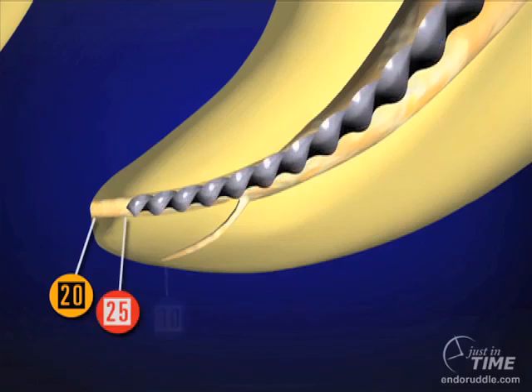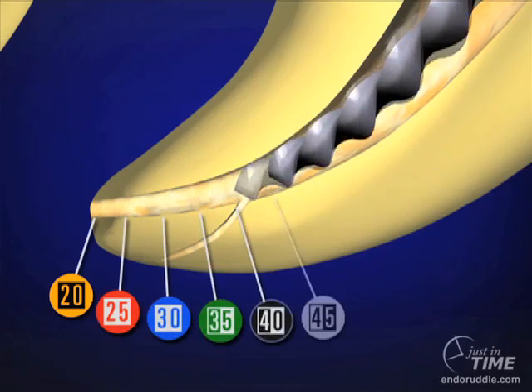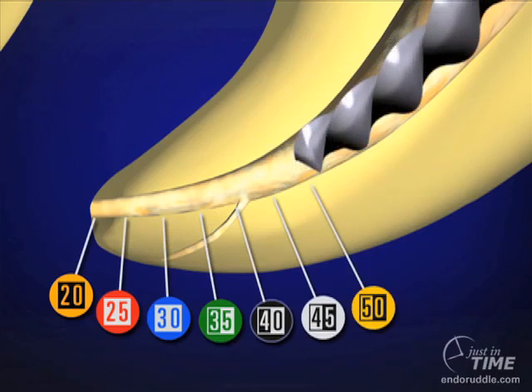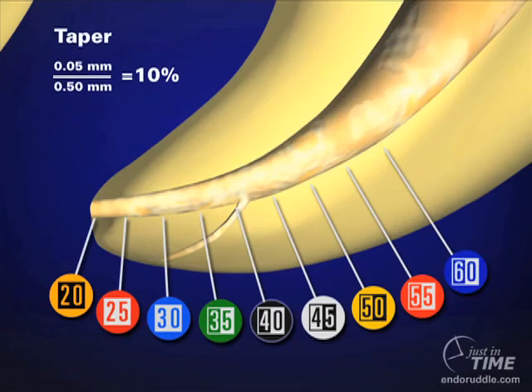If we were to look at this in animation, we're just saying that tuning is a clinical activity where we confirm that each larger file uniformly backs out of the canal. So what is our taper? We only use 3 ProTaper files.